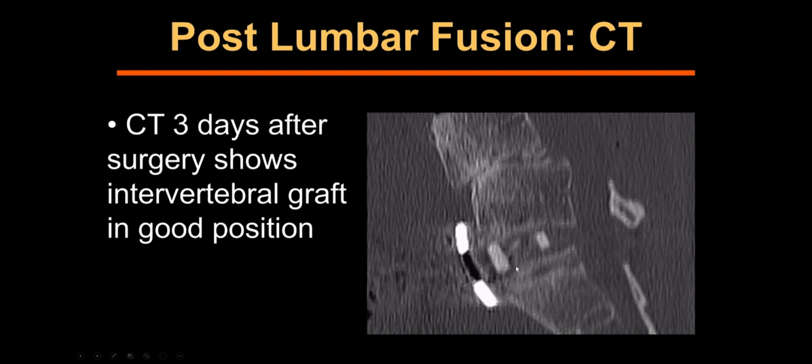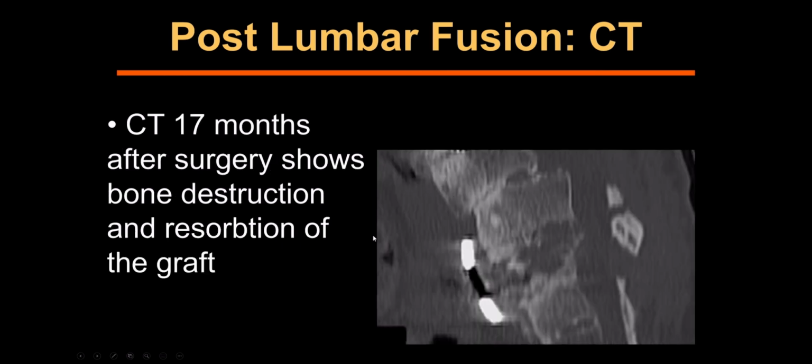A lot of times we'll get a CT within the first few days following surgery just to make sure that the hardware is in good position and graft material hasn't migrated and all that. I mean, one question I would ask is, okay, man, you operated on this level and everything looks good. Was there some reason you didn't want to operate here? Maybe they'd done a flexion extension and this guy was fused here, so there wasn't too much they could do. In any case, we gave him a clean bill of health. Great job. But after 17 months, the patient returns, obviously not doing well.